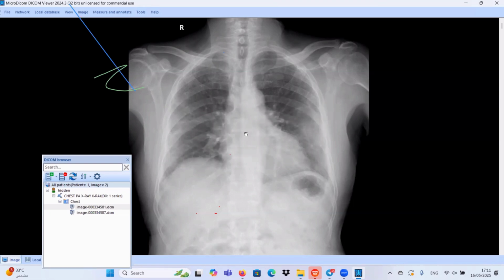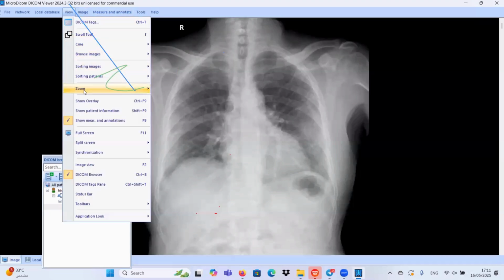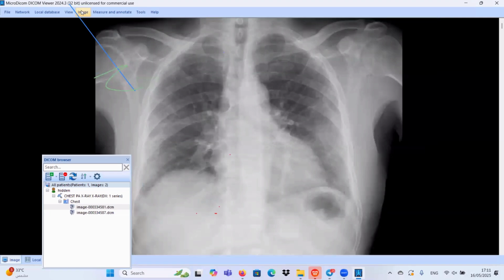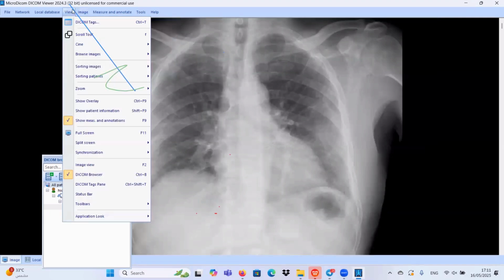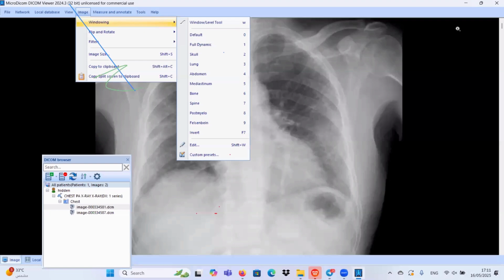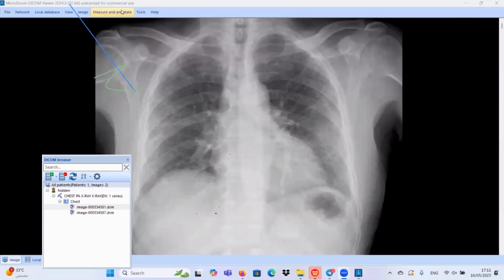We have here, as you see, can you comment on this case, please? So this is a chest X-ray, frontal projection, of an adult skeletally mature individual. I can appreciate bilateral volume loss, and multiple cystic areas with prominent interstitial markings and a prominent apico-basal gradient. Bilateral CP angles show some hazy infiltrates, although I cannot appreciate any pleural effusion.